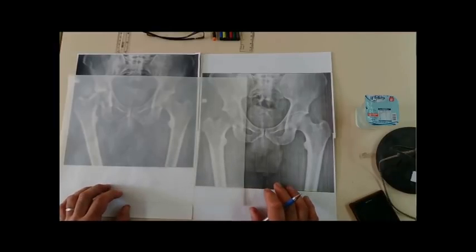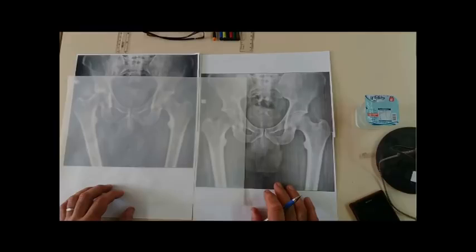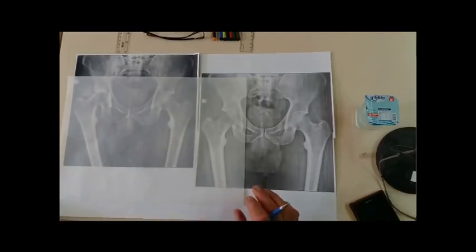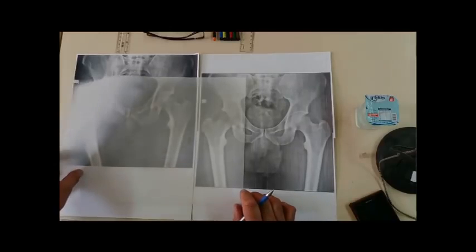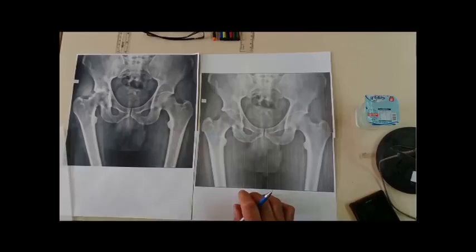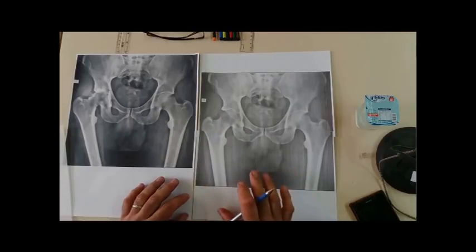So in this short video I hope, inshallah, to explain, or try my best to explain, radiographical templating. Usually radiographic templating passes through 4 stages or 4 steps. This has already been mentioned in the PowerPoint lecture.